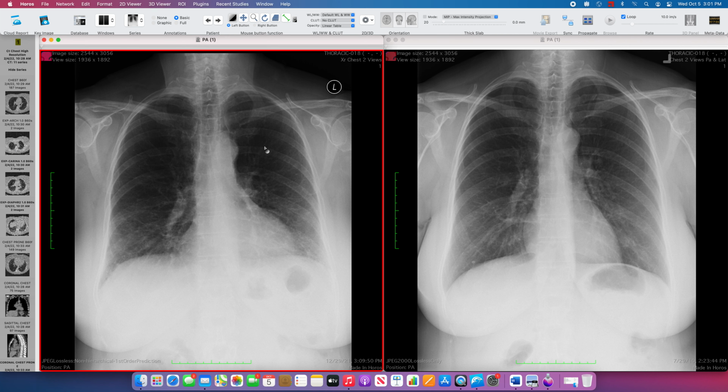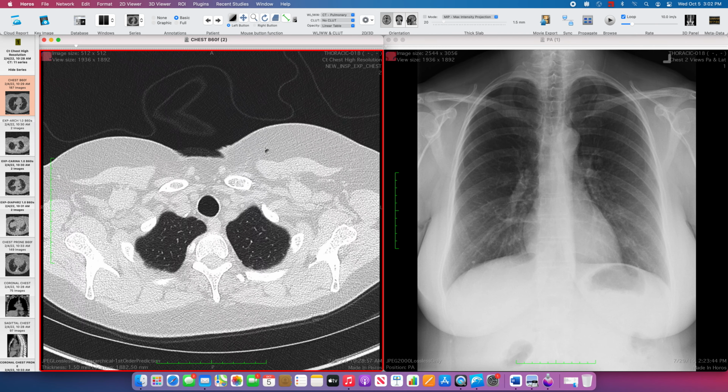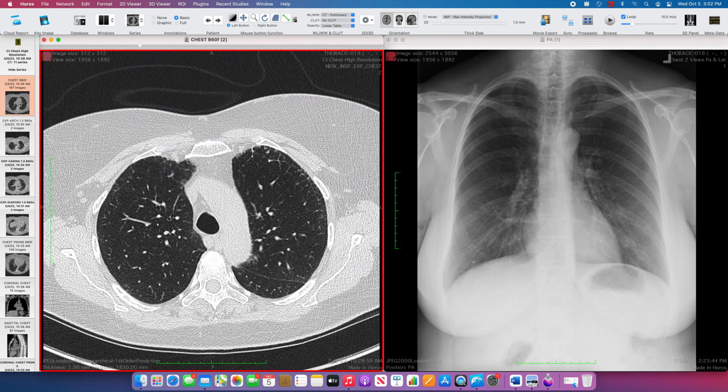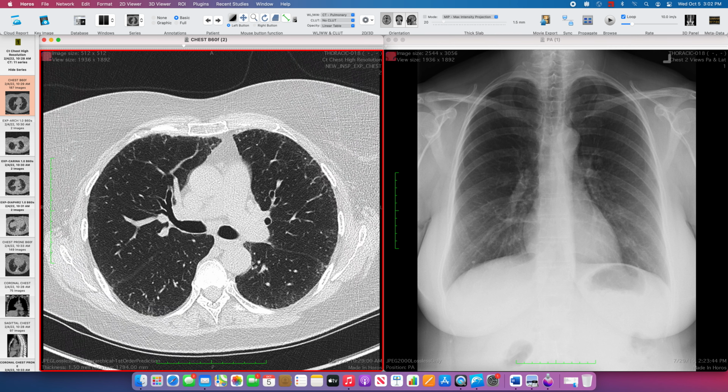So the patient gets a follow-up high-resolution chest CT, and in lung window, as we scroll down through this, we're going to see a fine peripheral reticular pattern. So again, notice all these lines out in the periphery of the lung. Notice also that within those areas of fibrosis, we get airways that are distorted and opened, and that's traction bronchiectasis.